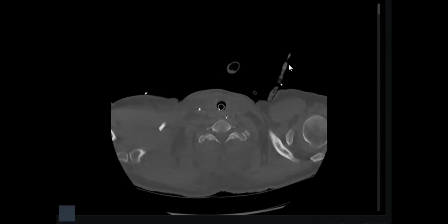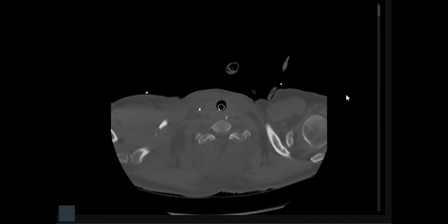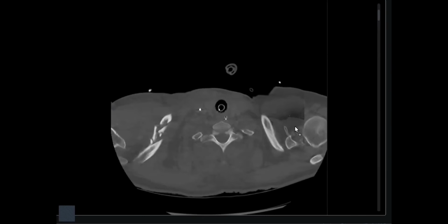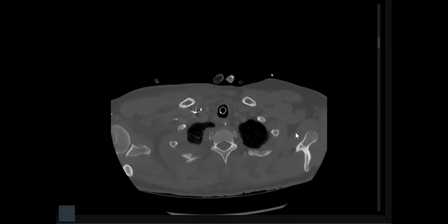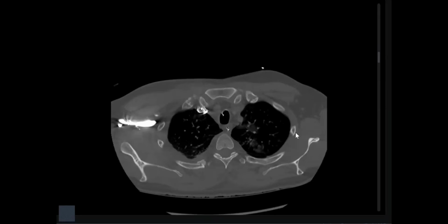Okay, candidate number 6. Yes, good. Okay, you have the control. I've been provided... now I'm scrolling, sir. Unable to scroll. Just scroll. Okay, I don't know what's happening. No, it's okay.